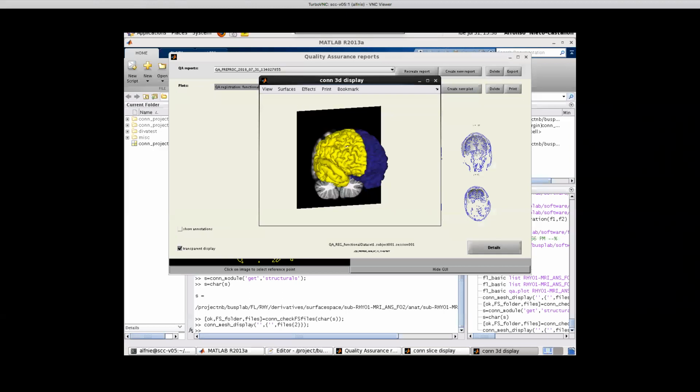Right. I think that in general it's easier to look at the FS average images because you can look at an inflated version of those and not hide the activation, and that looks better than the subject level information. We either display this or the white matter or the sphere, and neither. We do have that. So for each individual, you can look at the inflated surface.